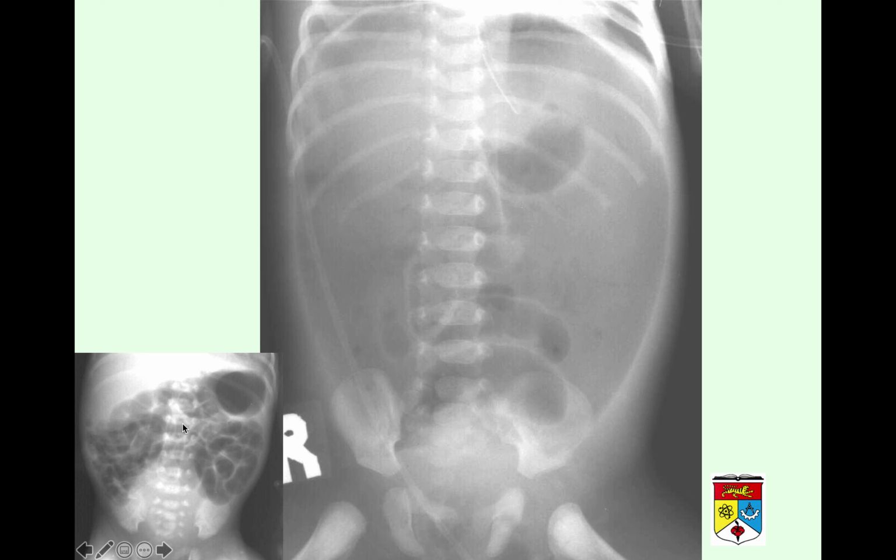It can have a complication, and like in this case the patient with NEC develops a pneumoperitoneum. So that is basically the complication you have to understand that can arise from a case of intramural air. Okay, so basically intramural air indicates bowel ischemia. The bowel becomes thin and then it perforates, so it will introduce air extraluminally. Okay, so this is just an example of normal versus abnormal.